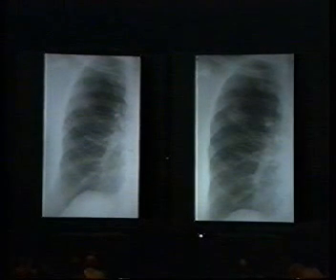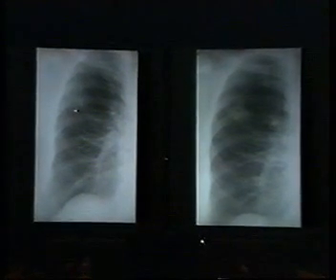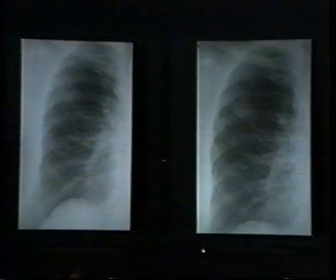These are radiographs in a patient who presented with an ill-defined right upper lobe nodule. Looking at this, we can see a little calcification on its edge. If we go back to a film 4 or 5 years earlier, we can clearly see a small granuloma in the right upper lobe that we are now seeing in that location.